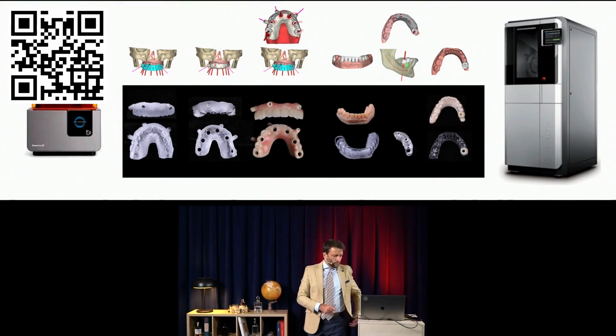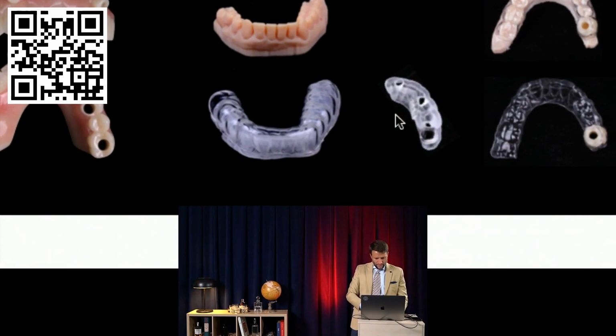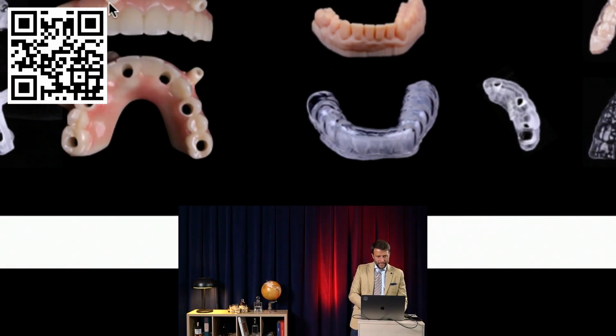So this is why what you see here, this is the cool part here. This is why we are sending to the dentist the lower design. This is the ideal design on the lower that is perfectly biting against this. And what do you see here? It's a guide to do the direct composite, copying exactly this. And then we have the implant guide for the single molar right here.